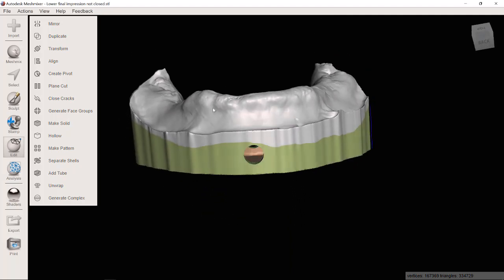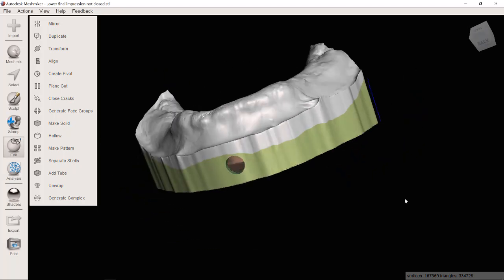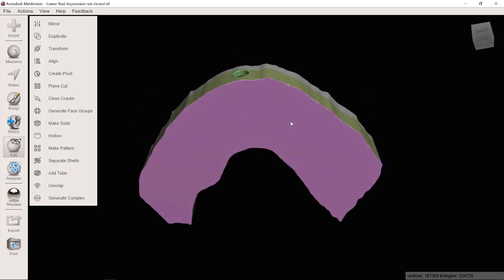Turn off our objects browser, and you can see now that this is a model that as it builds, there's somewhere for the excess resin to drain out, and all we'll be printing is this 2 millimeter shell all the way around. But you've still got a nice flat base that you could put directly on the print bed if you're wanting to print supportless.